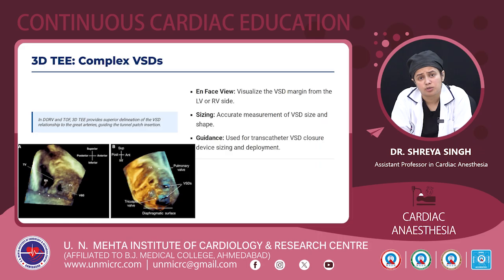Complex VSDs can also be seen on 3D TEE. In the en face view, we can visualize the VSD margin from the LV or RV side. Accurate measurement of the VSD size and shape can be done, and it can also be used for transcatheter VSD closure, device sizing and deployment.